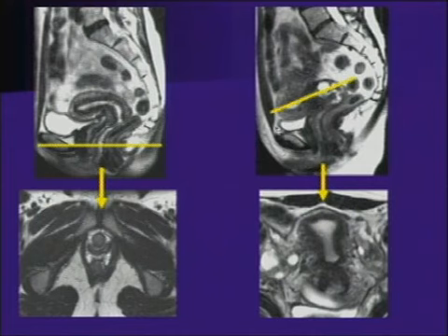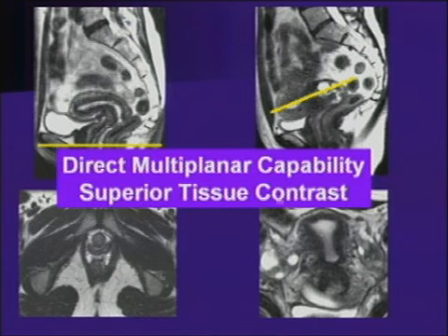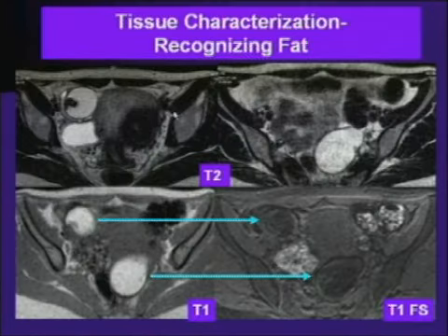We take a coronal slice of the uterus, a very important view to obtain, particularly when looking at uterine anomalies, when you really want to see that fundal contour. And one of the other things that I just want to point out is the detail of zonal anatomy that we see here, the normal high signal of the endometrial cavity, the low signal in the junctional zone, and the intermediate signal intensity of the myometrium, which also plays a significant role in your evaluation of the female pelvis.